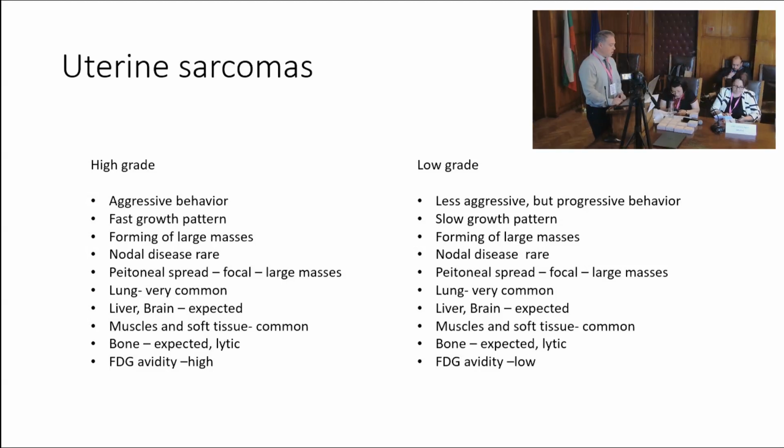The difference between low-grade and high-grade sarcomas, apart from their behavior, is the FDG avidity. Low-grade sarcomas, irrespective of whether they are stromal sarcomas or leiomyosarcomas, have low FDG avidity. Otherwise, everything is the same.